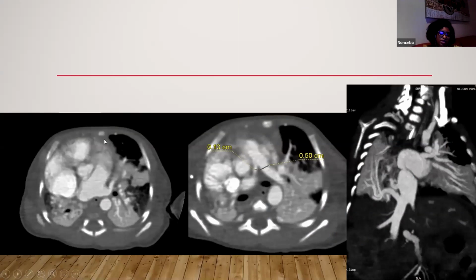Same patient, you can see the dextral position because of the hypoplastic lung. So now the heart is filling up, moves across and fills up the right hemithorax. This lesion only involved the right-hand side.